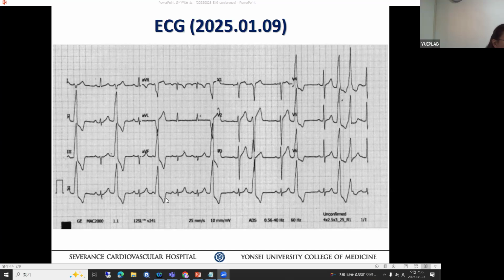So this is something that we're going to start moving forward with you guys. It's not simply just reading ECG anymore. We've got to discuss with you and start thinking this forward. Okay. Anything else you want to tell us? You said something about the different PVC there, the last big complex. What do you see? My question is why is the last complex different? What are the possibilities? We have to talk about that.